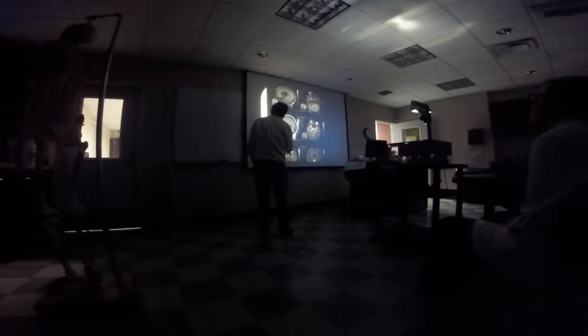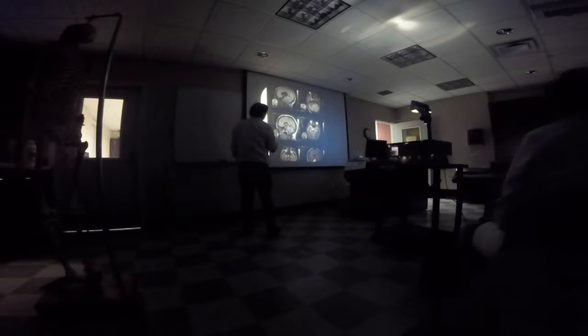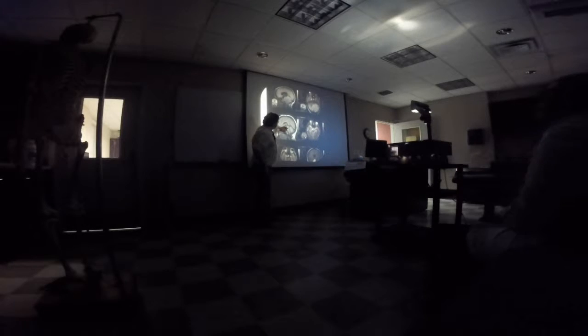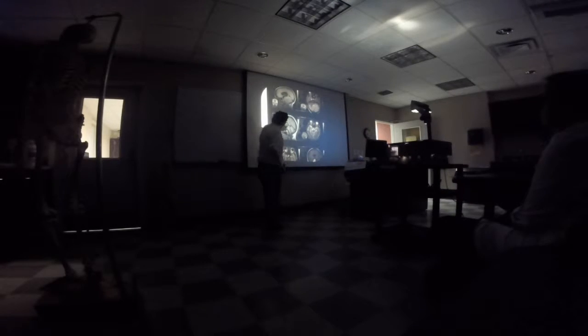Yeah, we said that was part of the limbic system. What is this here? Corpus callosum. Now, what is this right here? Midbrain. What is this channel passing through the midbrain? The cerebral aqueduct. Right, and then what is this here? Fourth ventricle. Okay. On top, along the roof of the midbrain, what is that?